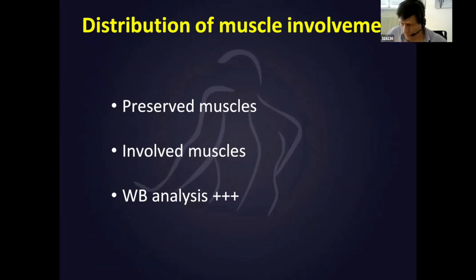When addressing a pattern analysis in a patient with unknown clinical diagnosis, it is important to observe the degree of severity of the patient's involvement in order to search for the most informative muscles. Early affected muscles will be more useful in mildly affected patients. It is a positive pattern, while those better preserved will be more relevant in advanced disease. It is a negative pattern.